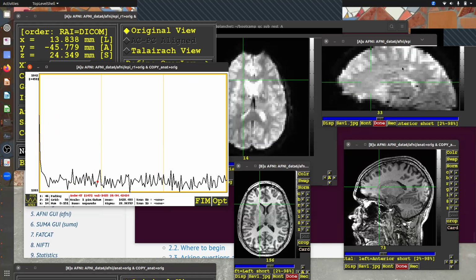you can see that this is what the brain looks like as a movie. And essentially what we're doing with fMRI is acquiring a movie of the brain, where it's snapshotted every 2 seconds or so. And the details of how that's done and the variability, there's a lot of different options that go into it. One thing that you may have noticed already as we're watching the movie, right now you can see it changing a little bit. It doesn't change very much overall. It looks mostly pretty constant with how we look at it.